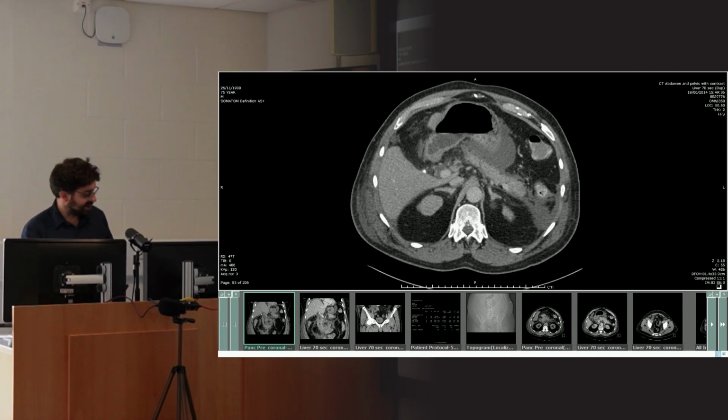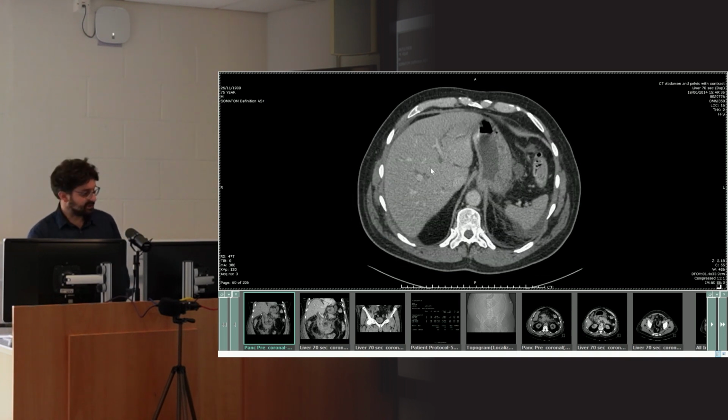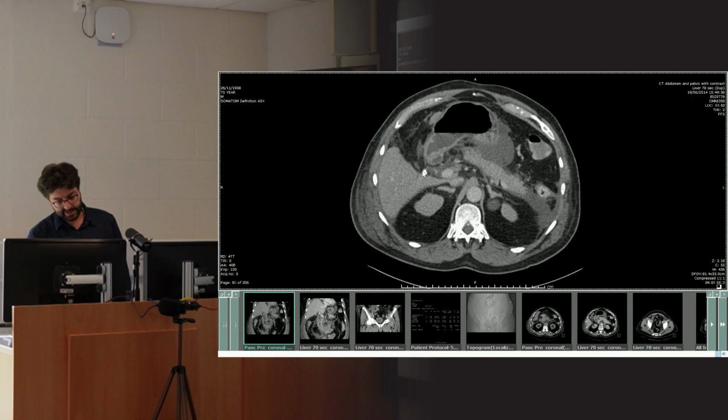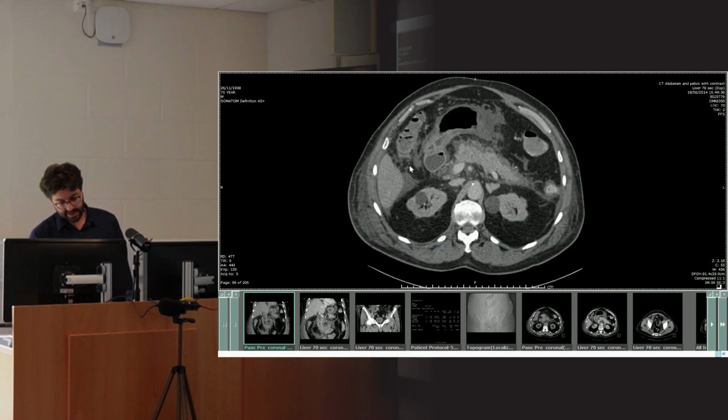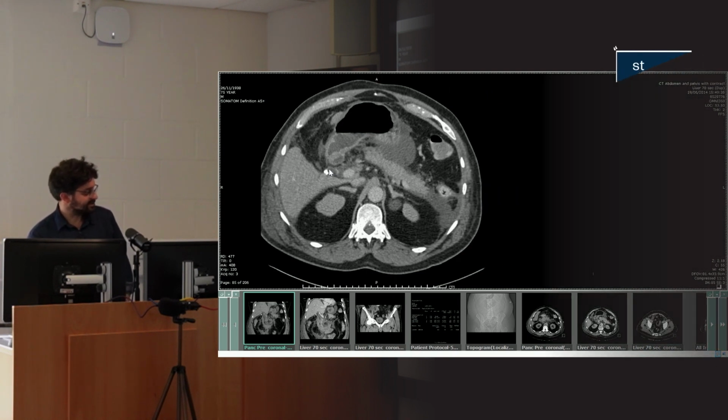Hopefully, you'll have a history if the patient had ERCP, though not always, and sometimes you have to hunt through previous imaging to see if they have had an ERCP or whatever. But we can look for gallstones. This patient, you can see, has got, well, I can't really see a gallbladder here. What I can see are these two very bright things. Density value over 1,000. What are they made of? Hounsfield unit value over 1,000.